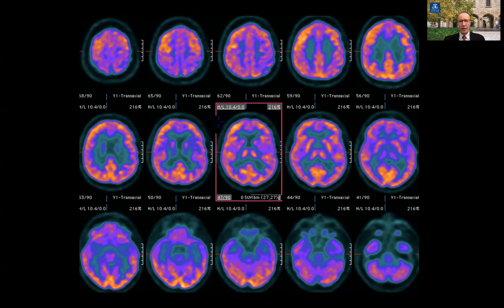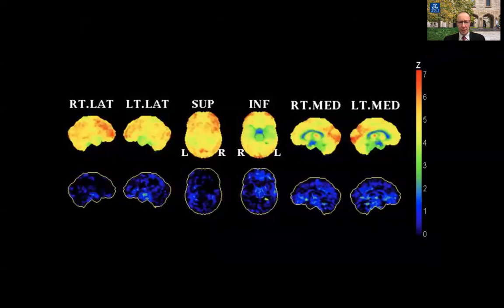Now, you'll remember from my first talk, FDG PET reflects the degree of abnormality. So in patients with mild cognitive impairment, you would expect the changes to be fairly mild. So you do have to turn your sensitivity up a little bit, but not too far, because you don't want to be making diagnoses of AD when people don't have it. So have a careful look. Here's the Neurostat.